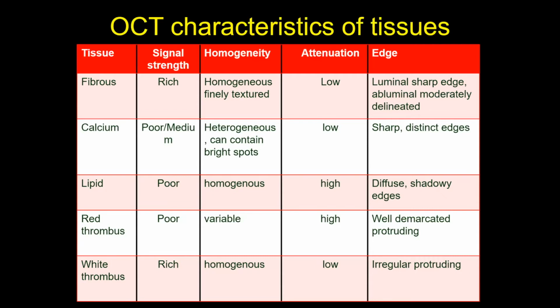Because the calcium is low attenuation, it does not obstruct the passage of light. That's why you can measure the depth of the calcium. You can see even beyond the calcium what the vessel looks like.